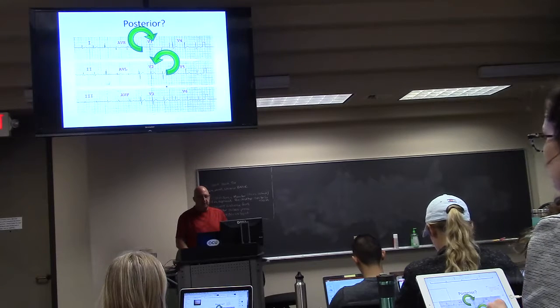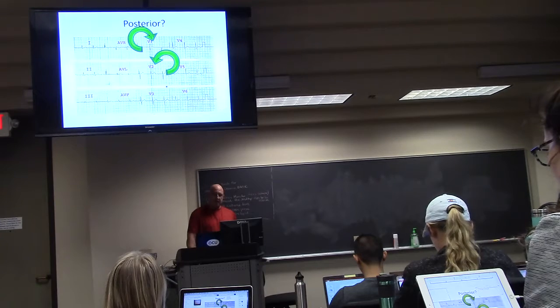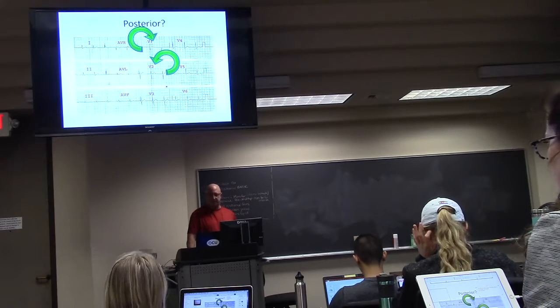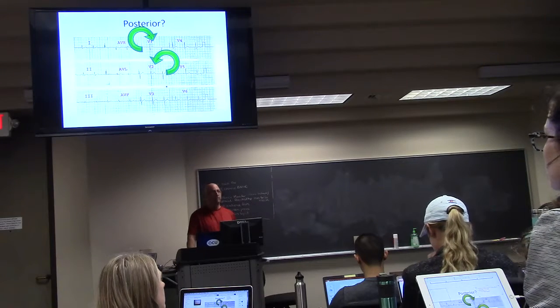You all know what the ST segment is, what the T wave is. Remember that the T wave should be kind of a bell curve like this. If you see that the front edge is being pushed up, what are you guys looking at right now?